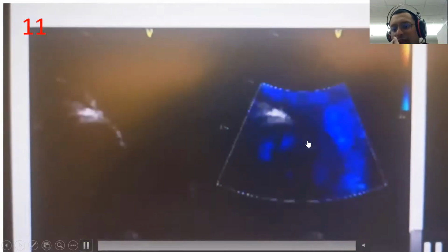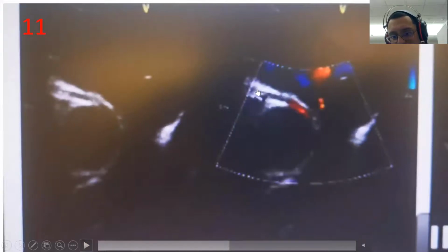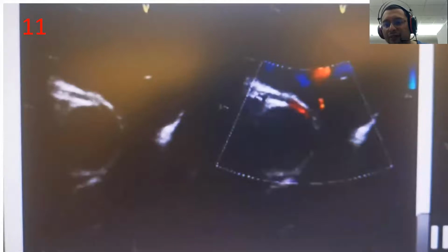Connection between two. Okay, so basically what you see is this is the right coronary artery, right? This is the left, right? This is actually a right coronary artery that comes from the left side. This is anomalous coronary artery. You can have right coming from the left and left coming from the right. Do you know that, Celine? No, again? You can have anomalous.